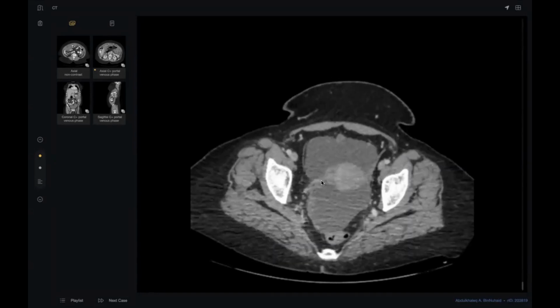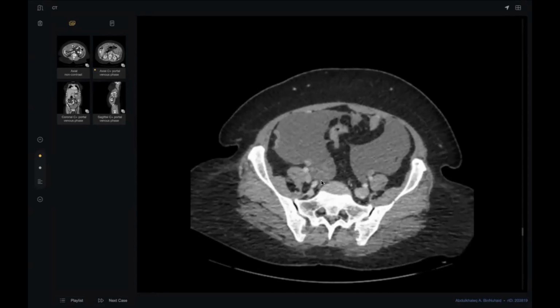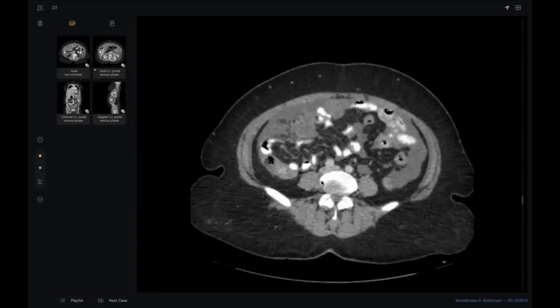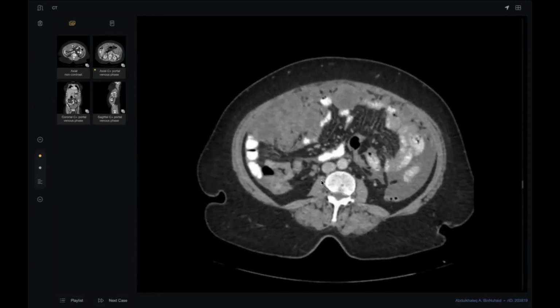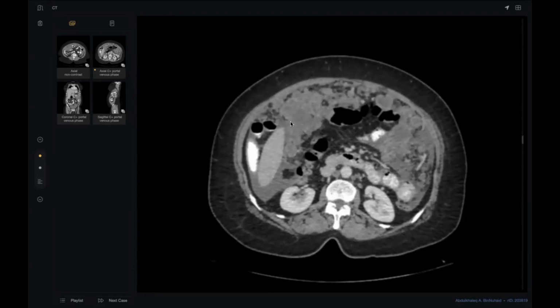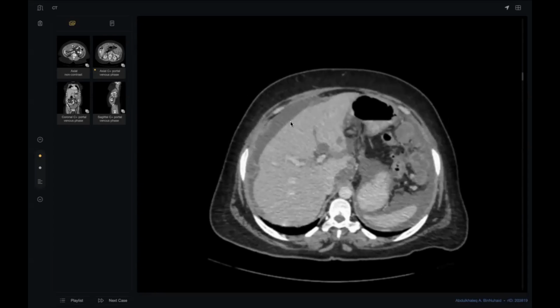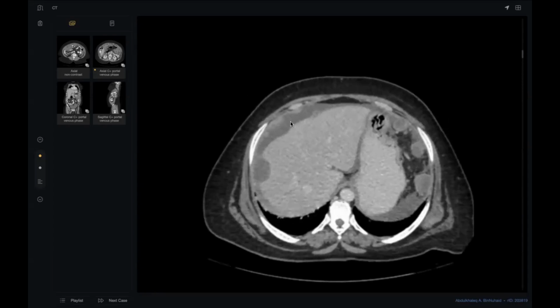And then see my colleagues, as I told you before, the most common pathway of metastasis in ovarian cancer is the peritoneum. See, extensive omental cake, incredible. Even look at the liver scalloping.